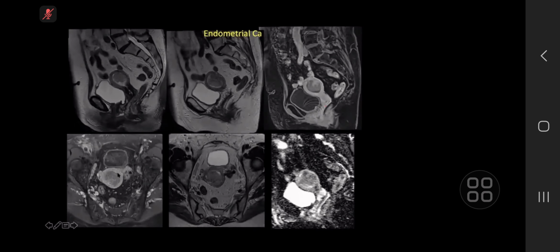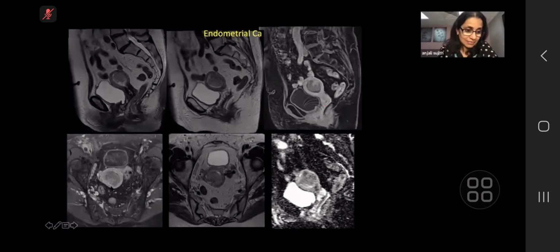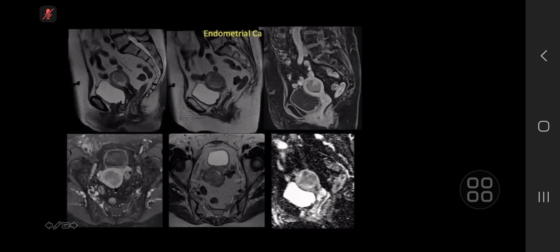Sorry, I was going to say, I think that there is some myometrial invasion, but... Good. I'm trying to decide whether it's more or less than 50%. I think I'm going to go with more.